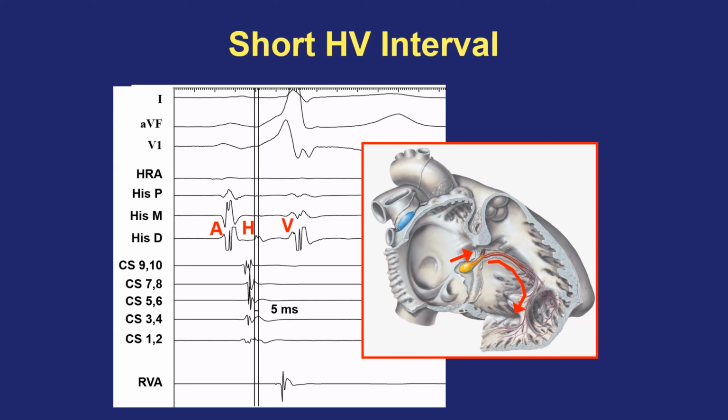This can happen in two predominant fashions. One is there could have been a PVC that happened to occur smack on top of a sinus beat, but sooner than conduction would have activated the ventricles. Or in this case, you could have gotten from atrium to ventricle through a different route other than the normal AV node in His-Purkinje network, that being an accessory pathway.